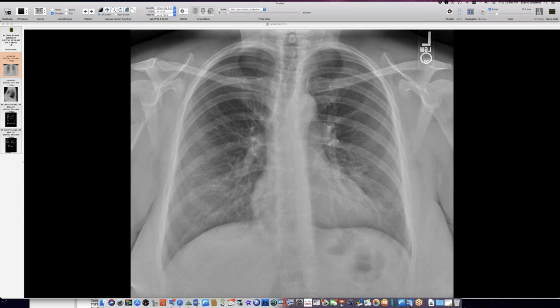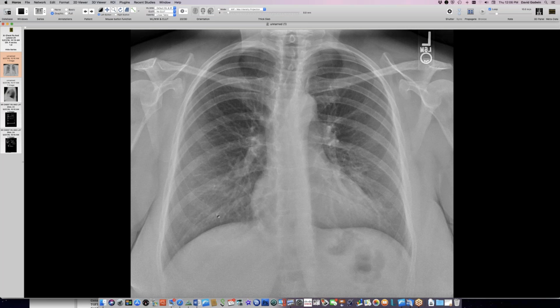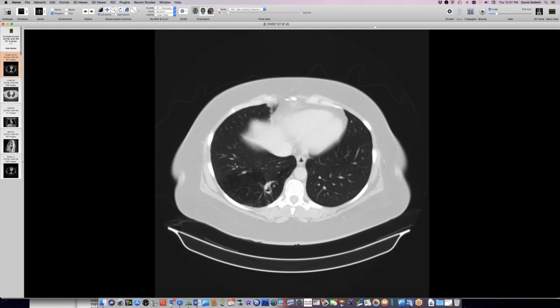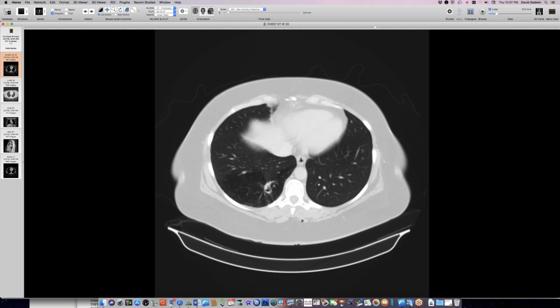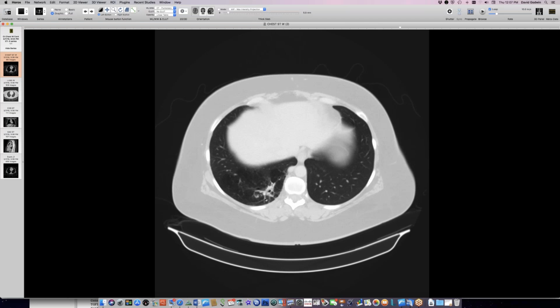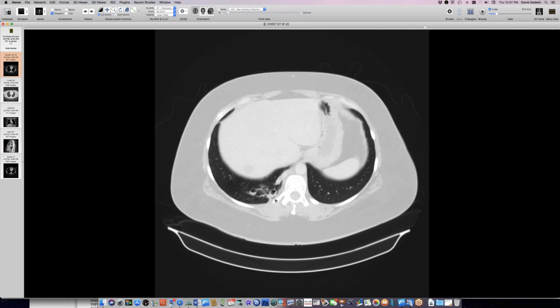Okay, people see a radiograph? We do. Okay, so pretty normal looking here. You know, don't really see much. There's a little mystery about to be disclosed down here in the right lung base. And it is this bubbly lesion down here. Looks like a big component of emphysema. Some strange looking bronchial elements here in the middle of this whole thing, and a systemic artery.